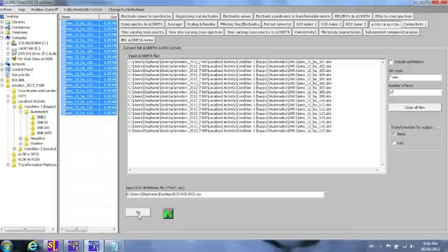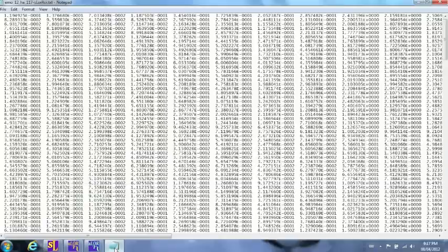Once you hit Go, a new text file will be created for each person. I've already created these files and moved them into a folder called sLOR to ROIs. I've got one open here so we can see what it's all about.